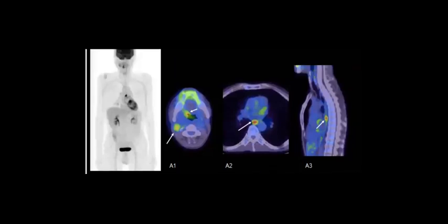This patient, as you see, is a 54-year-old male, and he has something here and here. And you can see the focal uptake here. In the regular case, the esophagus can take some uptake, but when it is focal uptake, it is not normal. So we find mid-esophageal high uptake in the esophagus.